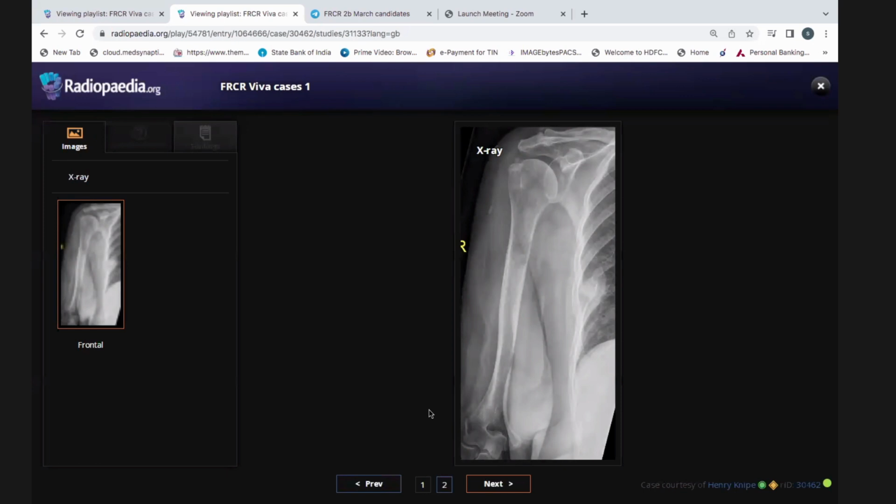Okay, this patient has presented with arm pain. So would you like to have a look at the humerus? Again, the patient presented with arm pain. In my routine practice, upon this clinical presentation, I should see another orthogonal view to check for any associated fracture or injury.